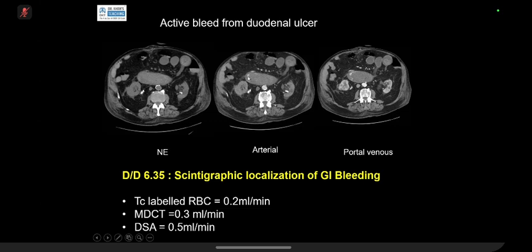This is arterial. Now on arterial, you can see a blush of contrast here, blush of contrast. Look at the same non-enhanced, and now you are sure it is bleeding. The venous phase will add to your confidence, and at times we don't consider it critical. But the same blood will slightly become more prominent. You see this thing versus this thing, and you will agree that it has moved a bit. But this is not critical, but these two are critical.